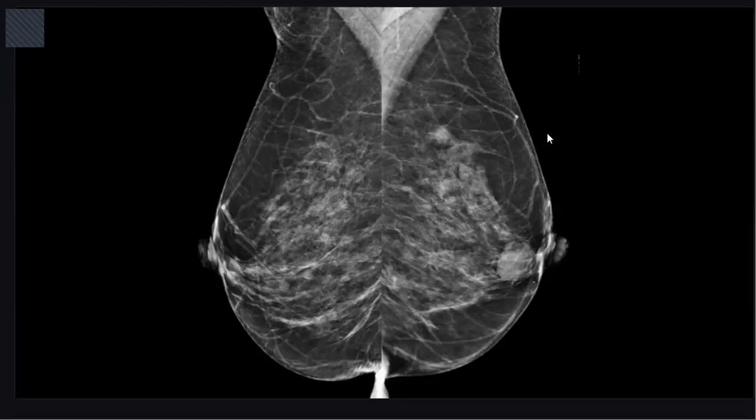Yes, here the right breast looks normal, no evidence of... Okay, so in the start you described the left, yes? Yes, I described the left side. Because you told the right retro earlier. Oh, yes. So concentrate on this. Okay.